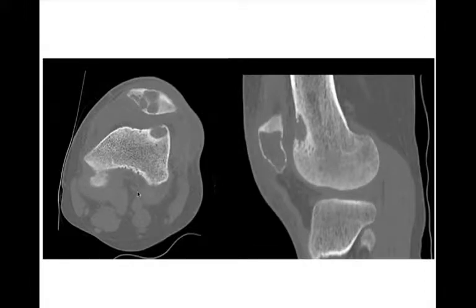Okay. CT scan, so axial and sagittal. So geographic lytic lesion, narrow zone of transition, sclerotic border in the femur, and several in the patella, or maybe it's all just one big one. Certainly thins the cortex a lot here. Maybe there's some cortical breakthrough. Is there anything specific about this lesion? No. Statistically, if you see this in an older patient, you're going to think metastasis or multiple myeloma or something like that. Again, nothing specific. Again, age is your friend. These turned out to be brown tumors in a patient with hyperparathyroidism, but I think it would probably be hard to arrive at that diagnosis prospectively.